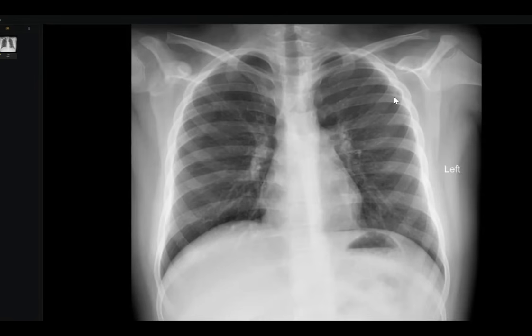This is a trauma patient. Okay. What is the most common cause of pneumoperitoneum in children, post-traumatic children? Pneumoperitoneum can be due to duodenal rupture. Excellent. And it can be any hollow viscus perforation, any blunt trauma, seatbelt injury trauma, if the patient was in a car, and another possibility can be if the patient has ingested any foreign body, it can lead to puncture and pneumoperitoneum.